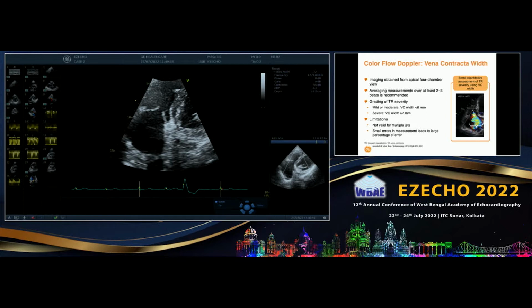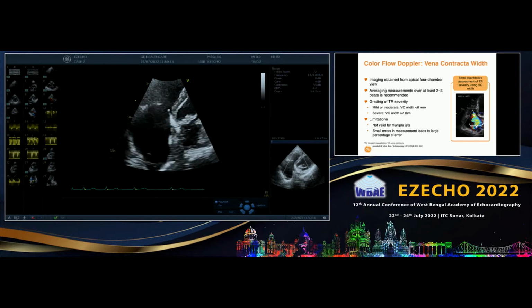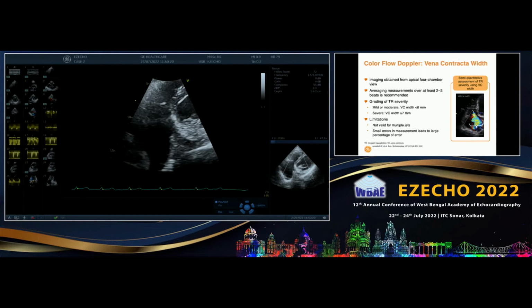And this patient needs an annuloplasty, whatever may be the annuloplasty. Otherwise, postoperatively, if you give a diuretic, it will be grade 1, grade 2 TR. You give him saline 500 cc, it will be a severe TR. But what doesn't change is the vena contracta, the non-coaptation. That annular remodeling tells you that this is going to be a severe TR, and it's never going to change even if you fix this mitral valve. Even if you bring down the PA pressure, this TR is going to remain voluminous, and TR begets more TR.